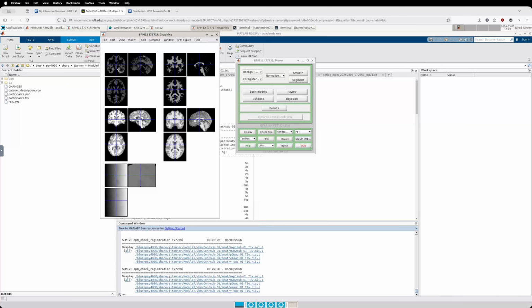We can see gray matter, we can see white matter, we can see them together, and it's going to just show us, okay, so we have these files, they exist, and we want to see what they look like. And so we could do that for everybody, but really what we can do is say, okay, now we really want to look at everybody's brains together.